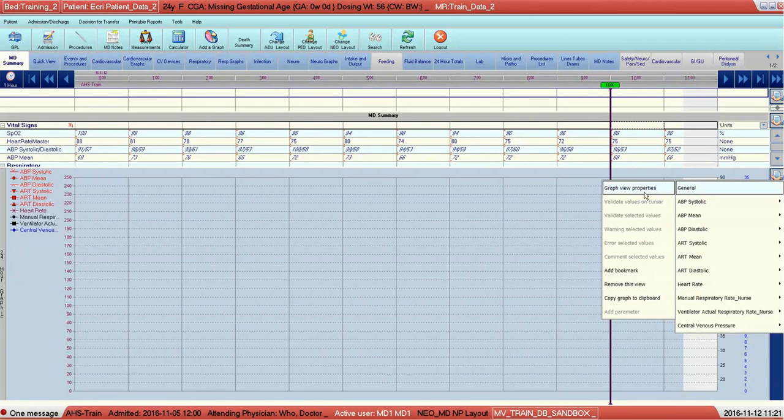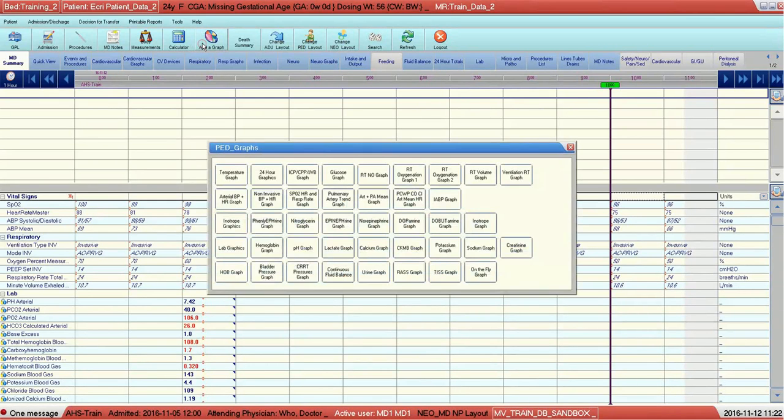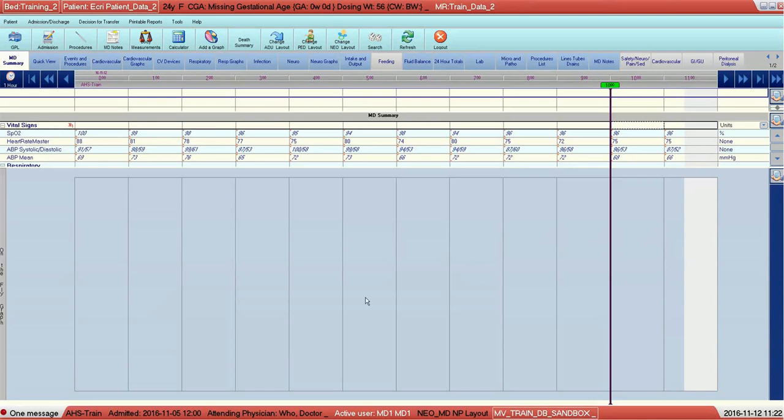It's just a preset graph that you can use. But probably the most helpful under the Add a Graph is the on the fly graph. And this is basically just a blank sheet that allows you to graph parameters against each other as you like.